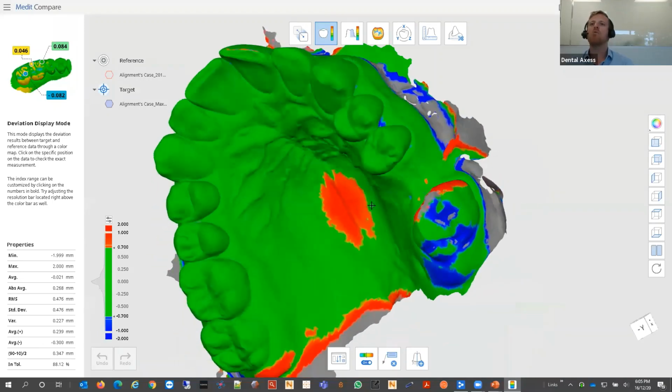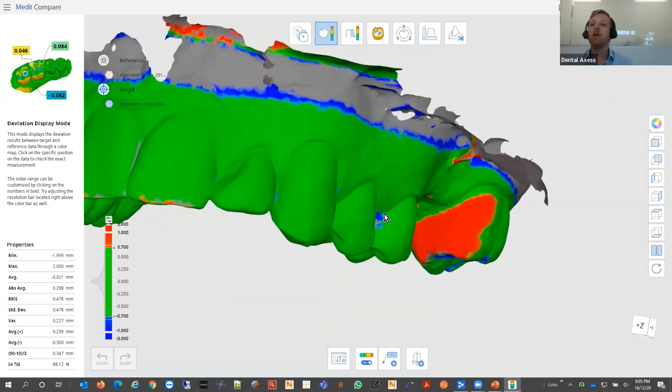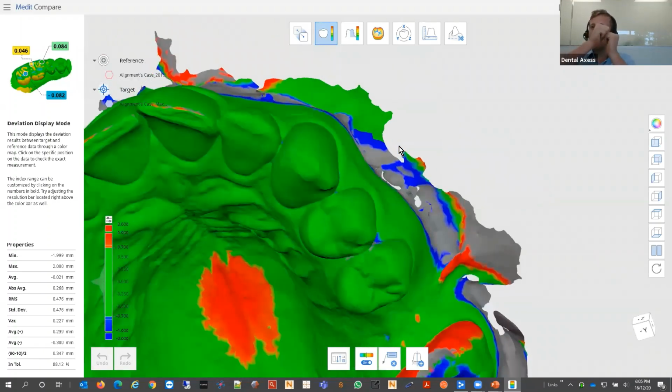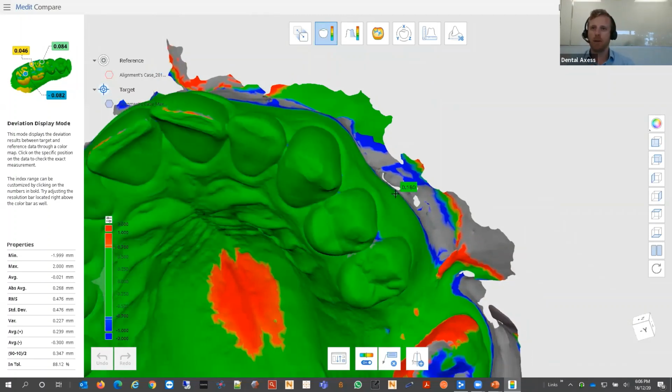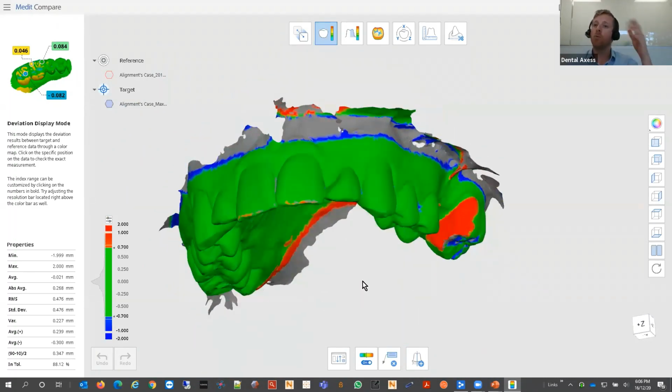So this is a really great tool just to say, aha, there's some movement. You could also, of course, do this with wear. So if the teeth wearing over time, say maybe someone grinds their jaw while they're sleeping, you could see how much they're grinding their jaw. Or orthodontics as well. You could show a patient, this is how you were at the start, this is how you are at the end of the treatment now. So it's a really cool feature, and I'm sure everyone gets this.